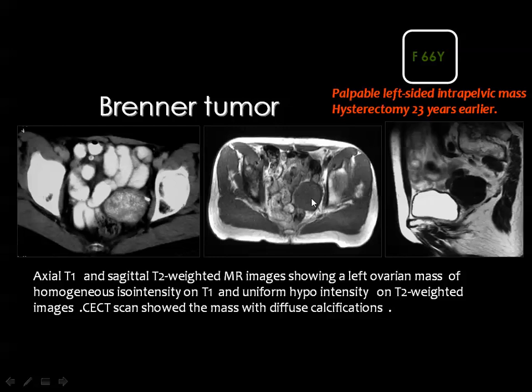you see the lesion of low signal, and in the T2 weighted image it shows very, very dark signal, like air, for example, in the core.